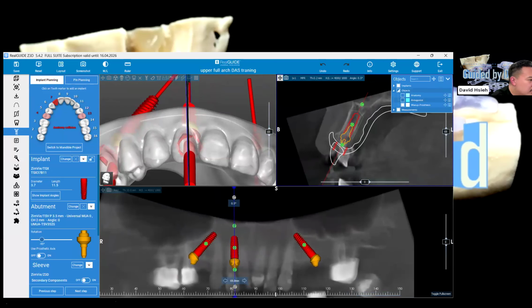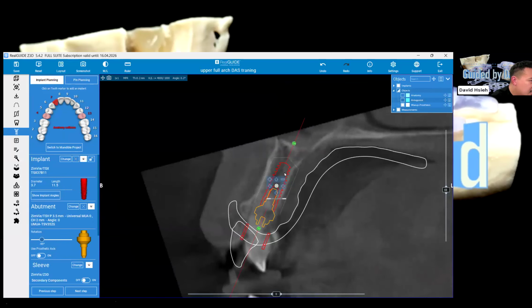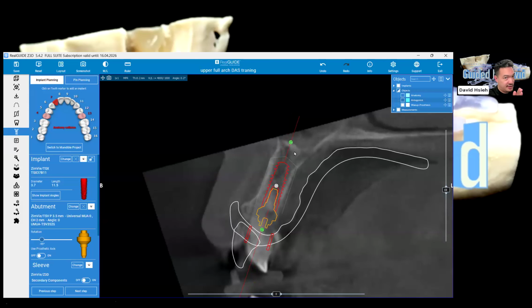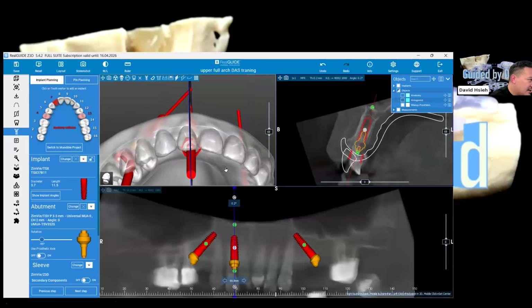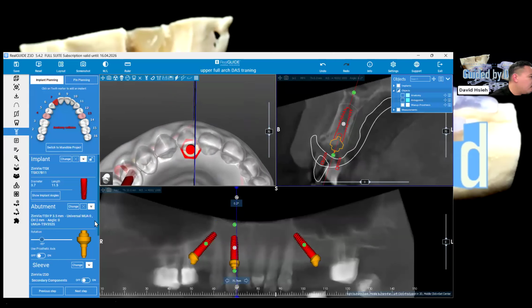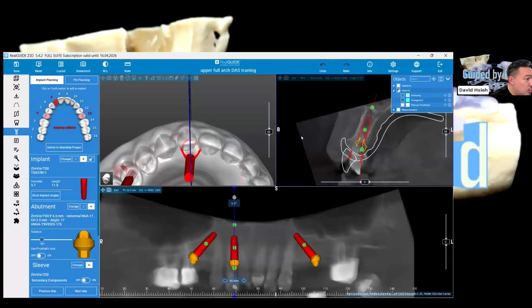So here, if we try to make this happen, we do have to angle it more, this way, and then tilt the apex of the implant more posterior to aim for that, right? Some doctors don't like it when the implant is too close to the buccal plate. So to this point, we can use a straight or a 17, based on your preferences. If it's a straight, it's basically pretty much looking like that. I mean, that will work. But if you want to stay away from bone more, you can use a 17-degree, and then now you have more room to play, right?